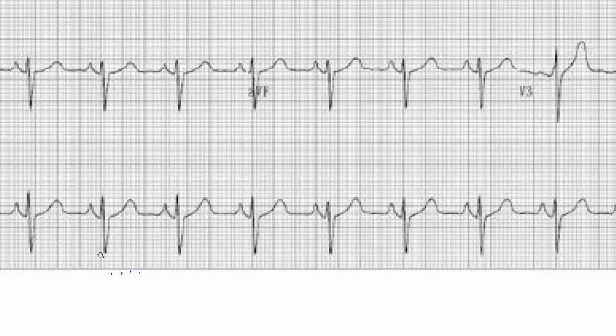If we start here, after 1, 2, 3, and a little bit more than 3, it's 300 divided by 3.5. But it doesn't matter, because if you have 3, it means 100. If you have 4, it means 75.